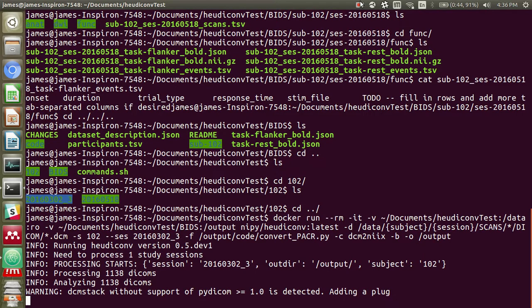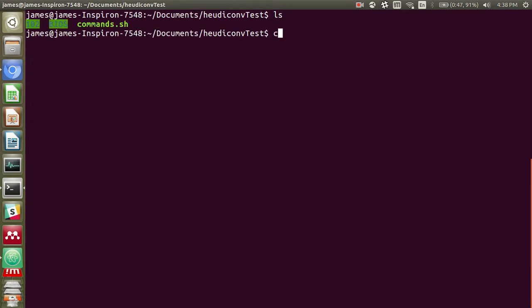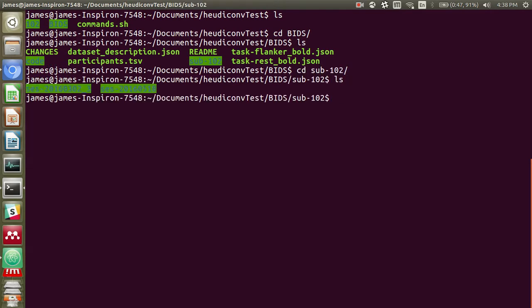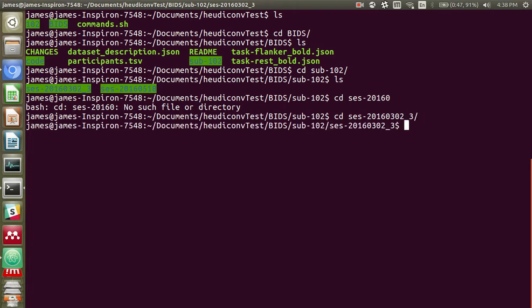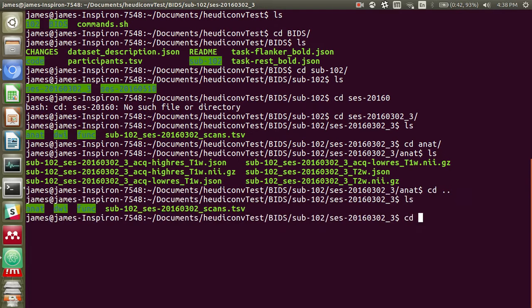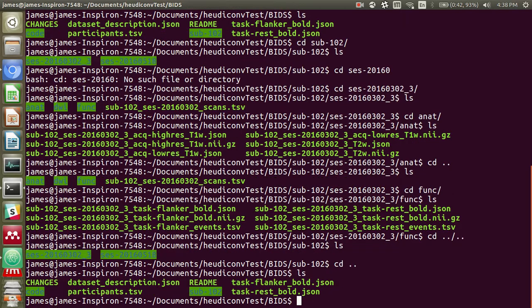So again, I'll pause the video because it'll take a little while for it to finish. Okay, and now it's finished running that as well. So we'll cd into bids and see what's changed. If we now cd into the subject, it looks like we now have two session directories. Oops, need to specify 03. Okay, and it looks like it's darn near identical except for the session being changed. So we have all the files there that we would expect, because in that session we collected the exact same type of data. So it should be all mirrored except for the date that we collected the data. And so it looks like it converted everything to a darn near complete looking BIDS dataset.